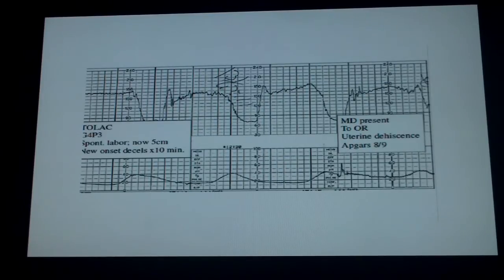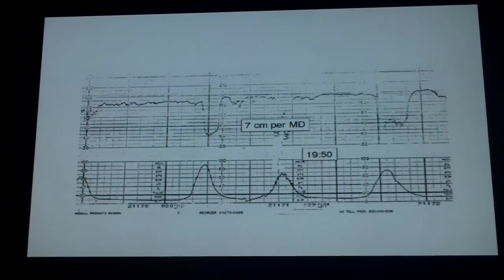There could be some cord compression, and it is affecting the uteroplacental perfusion. But your treatment is still the same, and if you had to call those anything, by definition, those are variables. Just another example of a strip here with some variables.